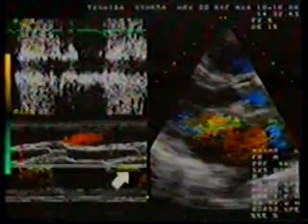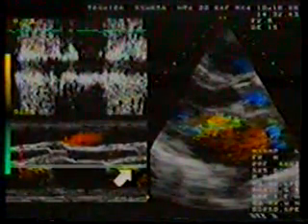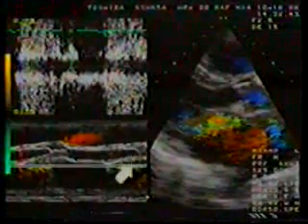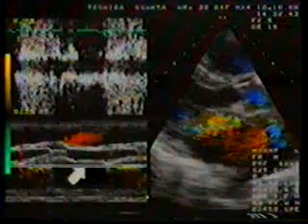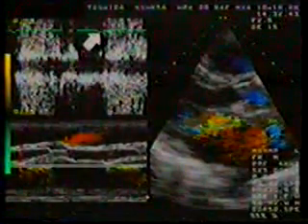The color signal of mitral regurgitation is seen in systole, just below the M mode of the opened aortic cusps. The horizontal line indicates that the Doppler sample volume has been placed at this level in the regurgitant signal. The QRS can be used to identify systole. This is a typical aliased signal of mitral regurgitation.